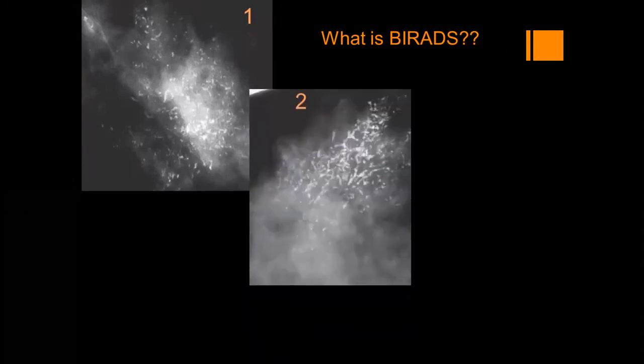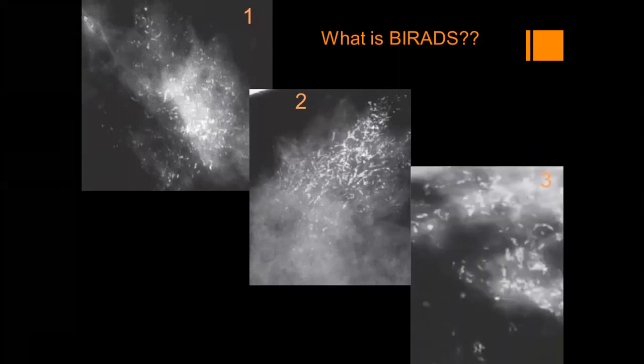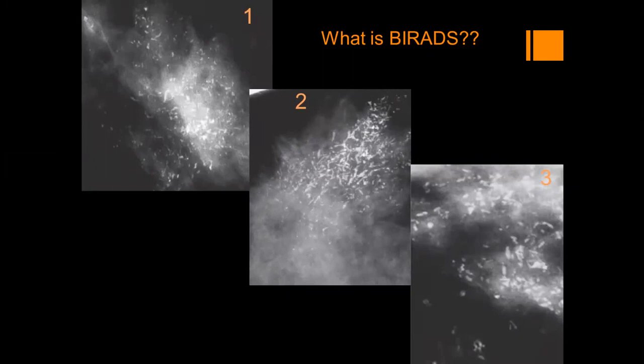What about this one? This also 4C. Or this one, it looks more towards segmental. Yes, but this is 4C or 5. Agree with you. And here, this one is polymorphic, segmental. I think segmental. Why polymorphic? Polymorphic, if you remember, linear. There is one linear. It's linear calcification, yes. This is linear.